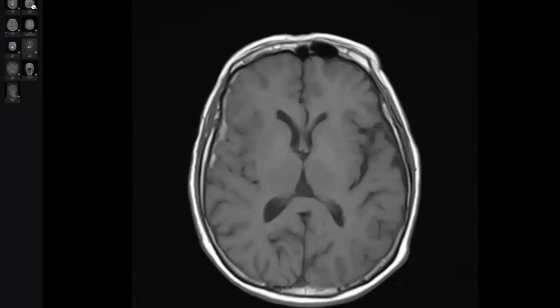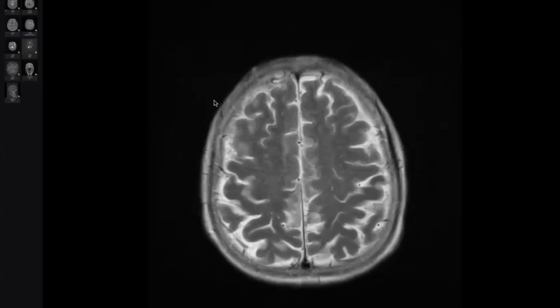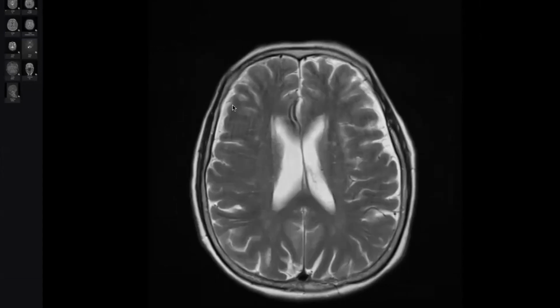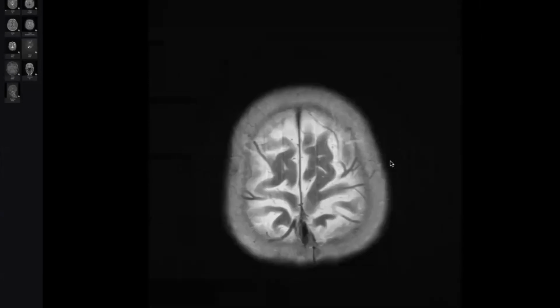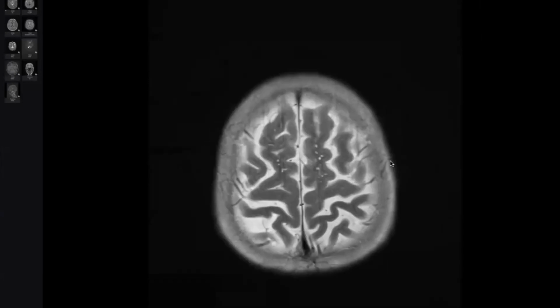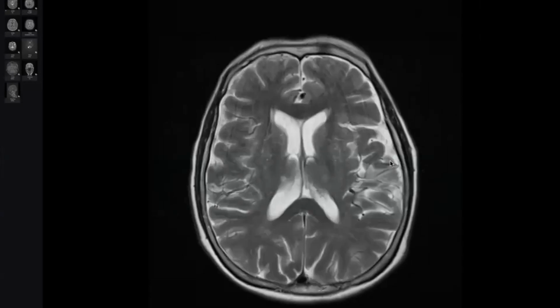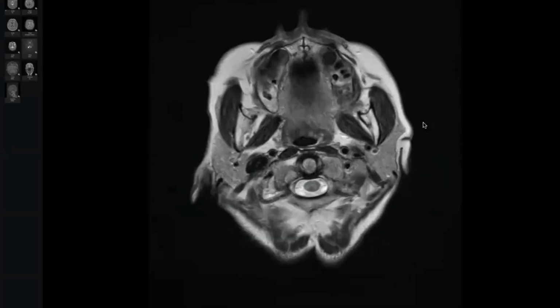By the way, my colleague, one of the most tricky areas is in the brain. The patient has a headache, so we are searching in the parenchyma. If I am in your position, I will look at the parenchyma and the ventricle, parenchyma and the ventricle, and by the way, I will miss this one. Then down, nothing.